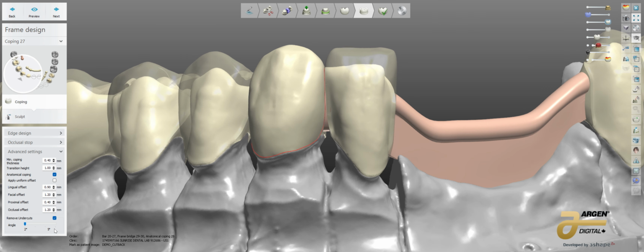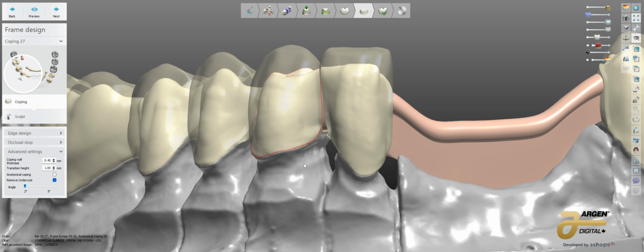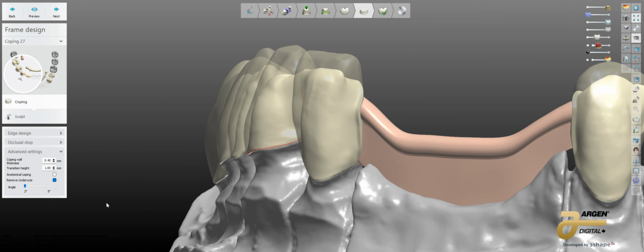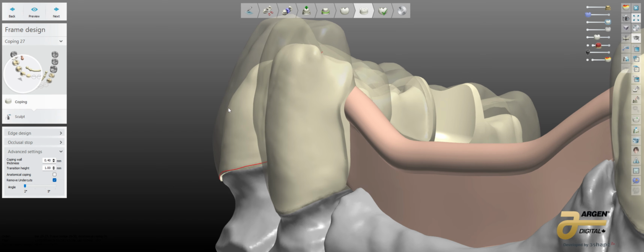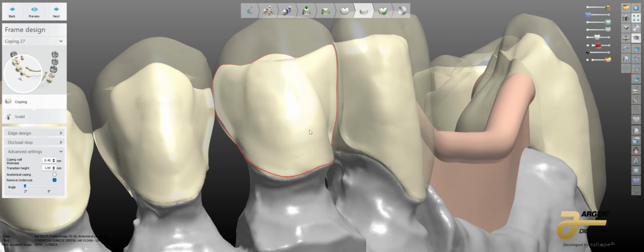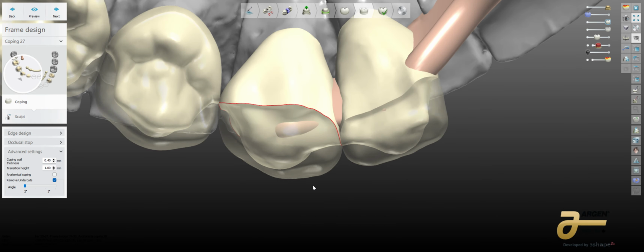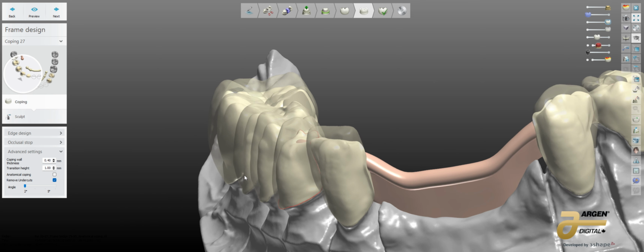So let's see. Let's go ahead and take that off here. Remove the undercuts and preview. All right. So now at this particular point, it's going to draw. You can see that it's coming back into it at this point, right? Is that ideal for what we're trying to talk about? Well, maybe. So let's go ahead and talk about what I was referring to here.